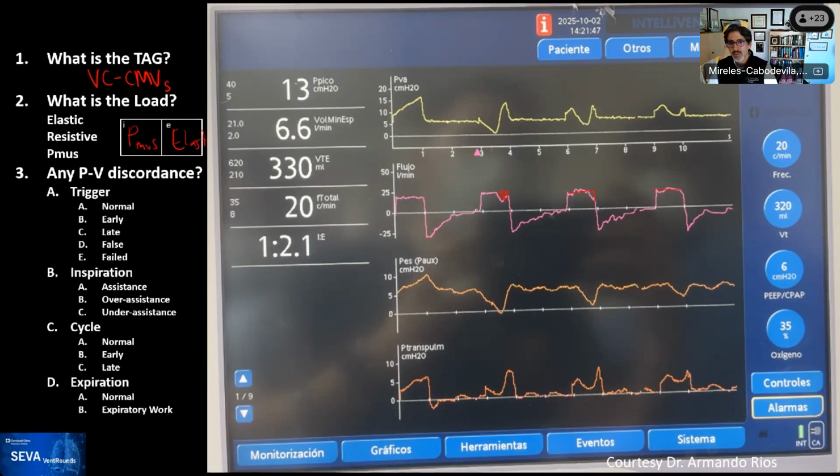It returns to baseline. Actually here it's very perfect, even below 2 seconds. Normally in a normal environment, it would end up in around 1.7 to 2 seconds. So that means that this patient has elastic, which is the normal physiology. So very good. Rob, comments? Nope, that's perfect coverage. Excellent.